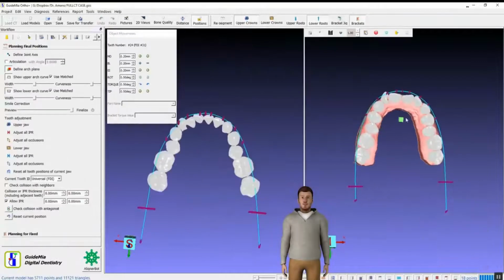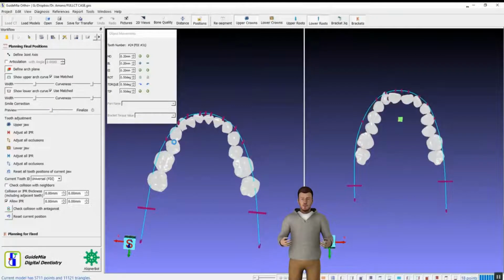The slider here is used to show the teeth expansion we need to do automatically, starting from the initial phase of the case. This operation will align teeth according to the curves and tooth orientations, measuring the interproximal collisions, etc.